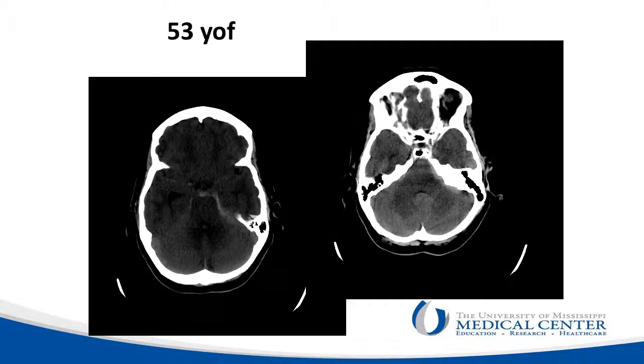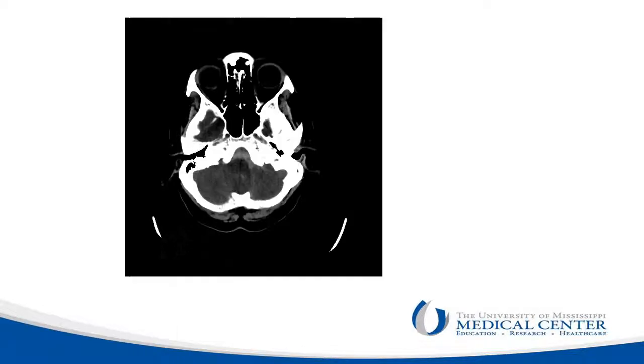This is another case. A 53-year-old woman presents. The non-contrast CT of the head shows hemorrhage primarily located in the posterior fossa and in the region of the left greater than right midbrain. Another view shows hemorrhage anterior to the medulla.